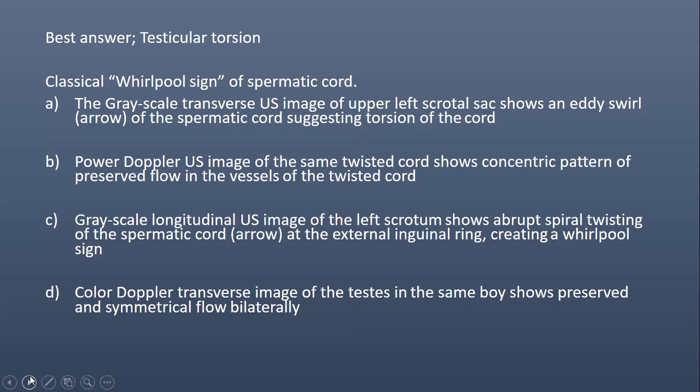You can use any words as long as that sign can be interpreted by someone who is a professional. Because most of the things that the doctor is going to look at down there is the conclusion. However, us as sonographers, we shall go to your report in the body and look at what you described. I see some people saying maybe this person is having pyelonephritis, but you said the kidney is appearing normal, both in shape, size, and echo pattern. Where have you gotten the pyelonephritis from? So it's important that whatever you're describing up there correlates with what you actually have in your conclusion.